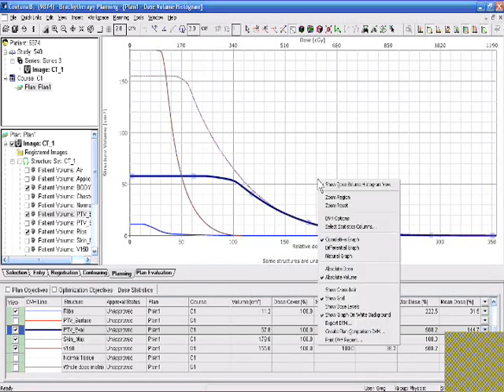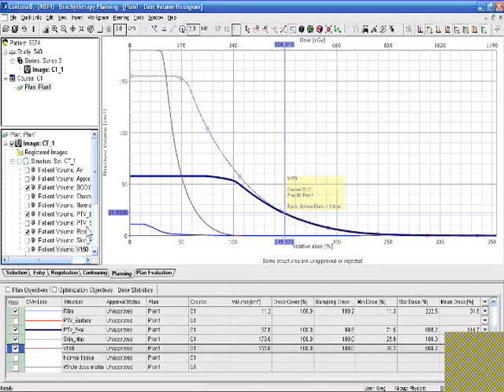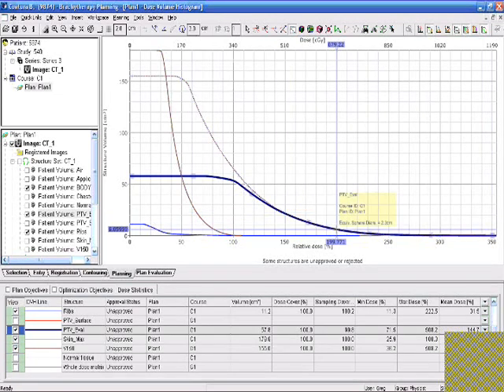And if we look at what the volumes are at those dose levels, let's see if I can get exactly 150 here. That's pretty close. We've got about 22 cc's for V150. That's perfectly great. And if we look at the V200, we've got about 6 cc's absolute volume. That's just fine as well. So so far, this is looking like a pretty good plan.